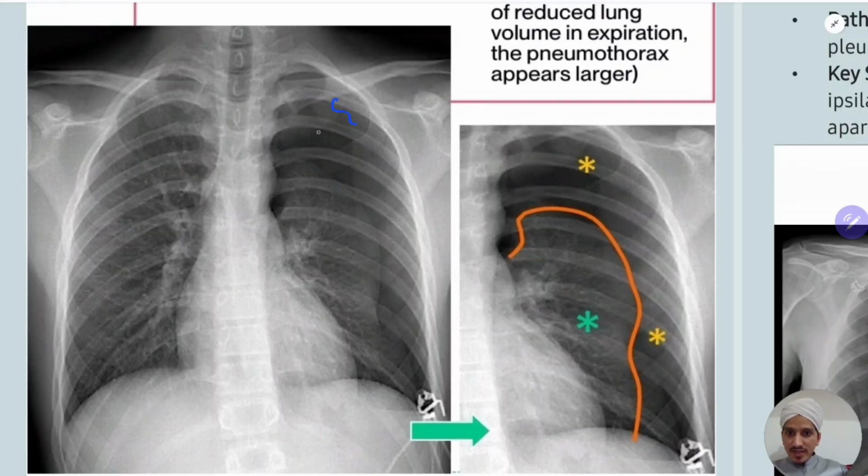Now you just see this. You are first seeing the pleural sign, this pleura. If I mark it, you can see it better. See this pleural line. And this is the hilum of the lung, which is now lower than the right hilum. So this is the pleural line, the lung visceral pleura.